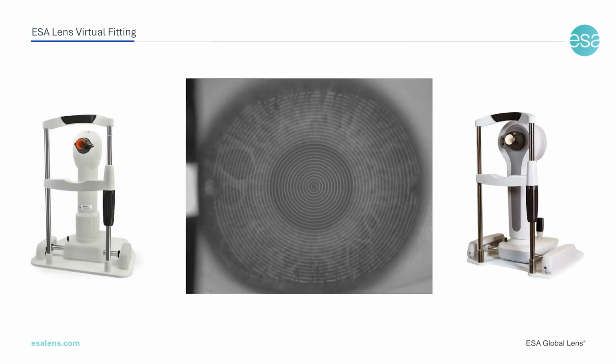The corneal center, which the program aligns with the center of the lens, can be determined using various methods. For Medmont E300 and Meridia topographers, which provide a corneal photograph with Placido ring projections and a known pixel to millimeter ratio, a specialized module has been developed. This module identifies the ellipse that most accurately matches the shape of the cornea's transparent zone. This ellipse defines the horizontal and vertical diameters, and its center serves as the geometric center of the cornea for all program calculations. In our experience, this is the most accurate option for achieving a precise fit.